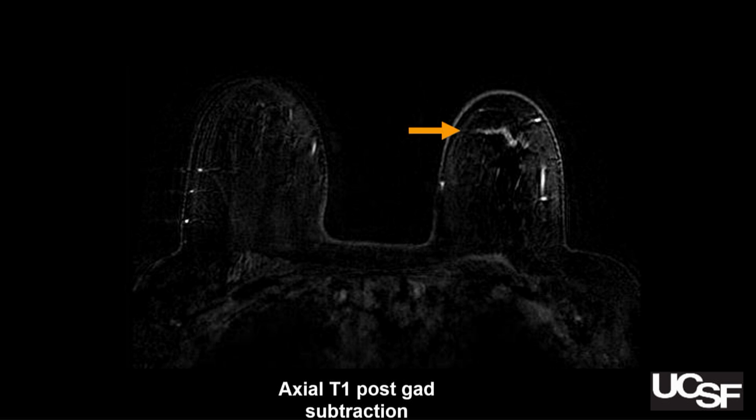Let me just explain what's happening. So strange shape should always get you thinking, okay, could this be artifact? This is artifact due to misregistration, and the key is looking at the pectoral muscle. So those of you who've heard me speak on this before probably figured it out already, but that banana-shaped, crescent, boomerang-shaped thing, that's where the muscle lives, that is a classic look for pectoral muscle misregistration. And usually it happens not because the patient's literally shifting deep and superficial, it's because the muscle is tensing and relaxing, right? So she's twitching.